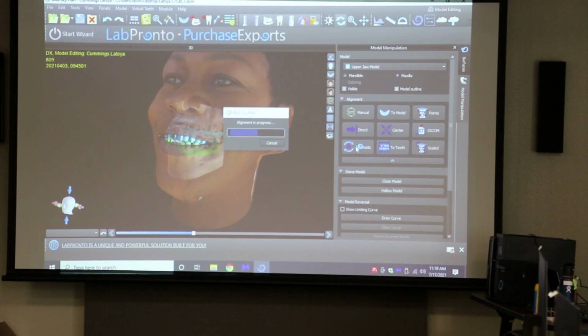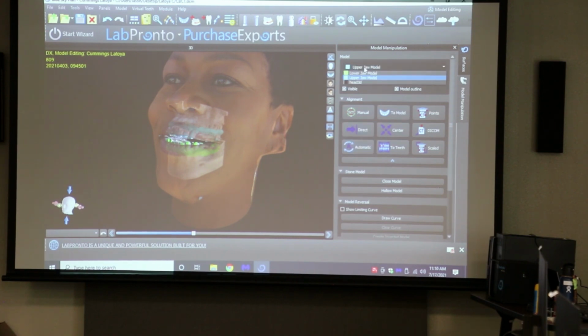Yeah, you have to use that slider bar on your diagram to get all your data to show. Yes, I was doing that at the beginning, I didn't understand what we were manually stitching. You're mainly just stitching her lips, right? Yeah, because that's all that you captured. Uh-huh, because my cone beam doesn't take a big field of view. Oh, okay.